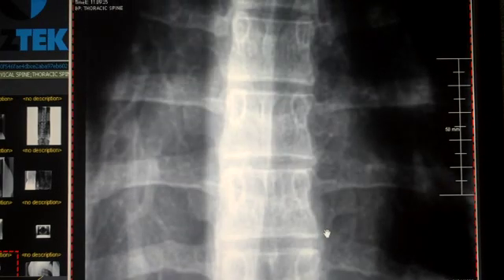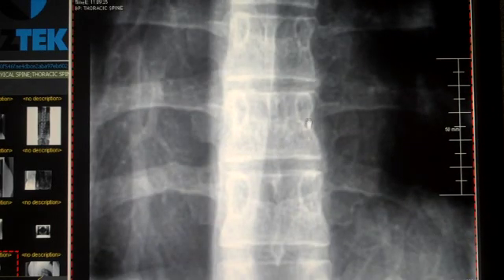All right, so when I'm looking at this segment right here, you can see the vertebral body, of course, is right here, all of this. You can also see that the pedicle is this structure right here. We can see that the spinous process comes down to right here. The inferior vertebral end plate of this segment is this, and the superior vertebral end plate is this. The transverse process is this structure right here, going up right here, articulates with the rib right there, and comes in right there.